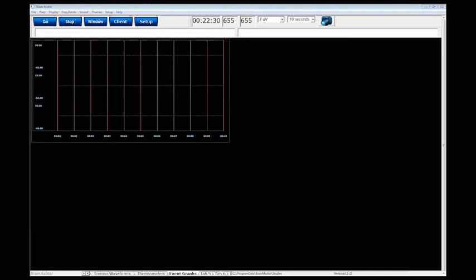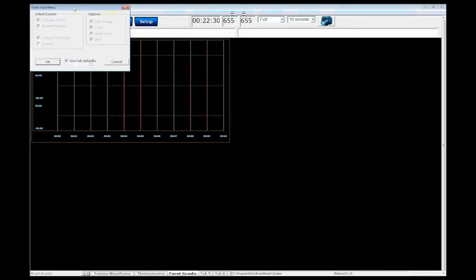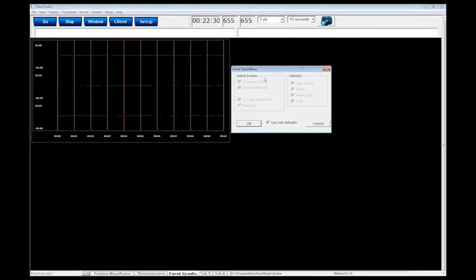Okay, so as I was saying, the final tab that we're going to go over is going to be the event graph panel. This event graph panel, once again, much like most other displays, has a panel option to go along with it. So when I right-click on this, it has different menu options that are available as well. Now, what makes this panel different than other ones is that the functionality of it has changed a little bit.